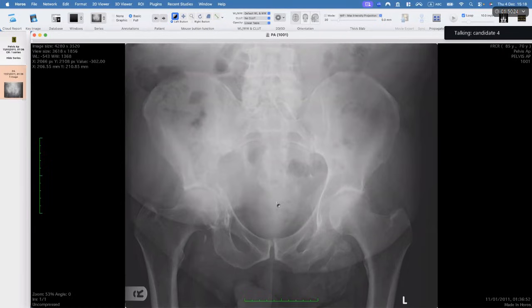And these findings need to be communicated to the referring physician. The patient can be further evaluated with a CT for confirmation of the finding, and orthopedic referral or fracture clinic can further be informed about this patient. Okay. Anything else? Before we move on, you may have time for another case.